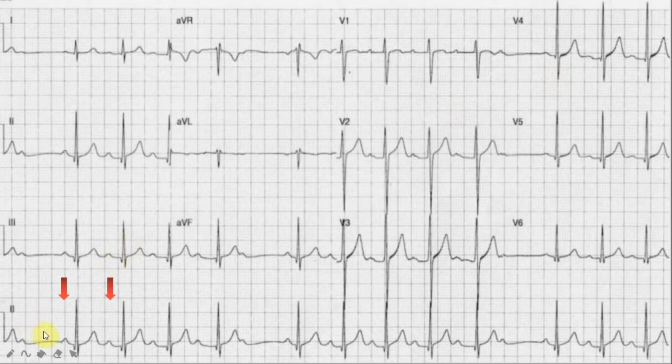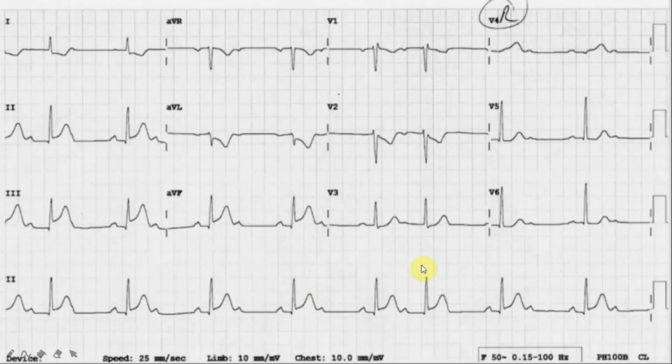So we have talked about the P wave coming at pretty regular intervals. Sometimes the P wave can be fused with a T wave, and it can be very difficult to identify that buried P wave. What you can do is identify the P wave and the PP interval, and usually from the PP interval we can predict where the next P wave is. So this is another interesting ECG, and Becky is going to talk us through the findings. Becky, this is all yours.